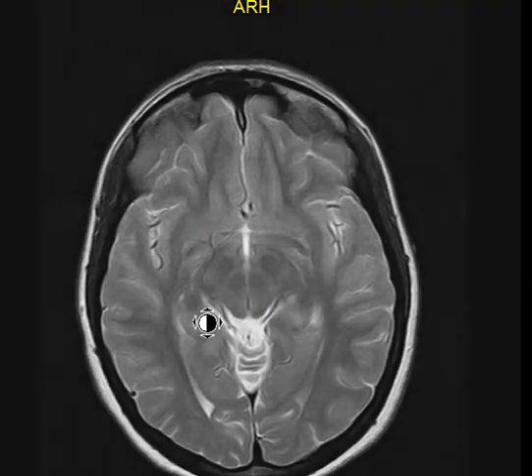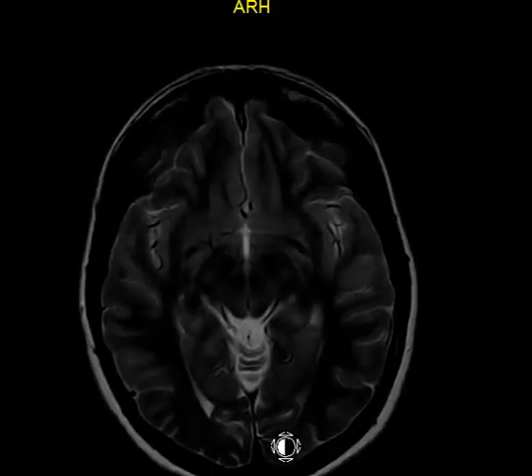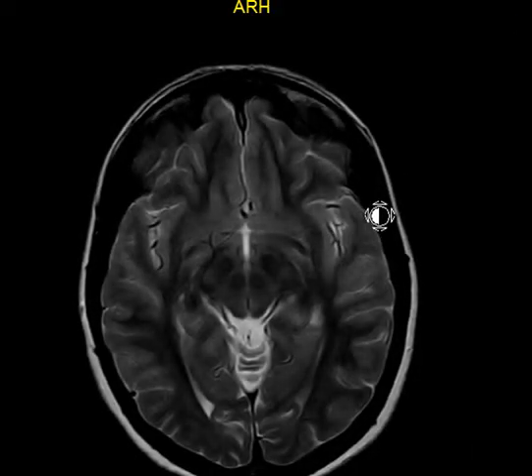Now, if we adjust the window just a little bit here, make it a little bit harder window, you can see these two dark dots. These are called the red nucleus or red nuclei. Why are they red? Because they contain iron. In real life, in anatomy, they contain iron, so they appear red.